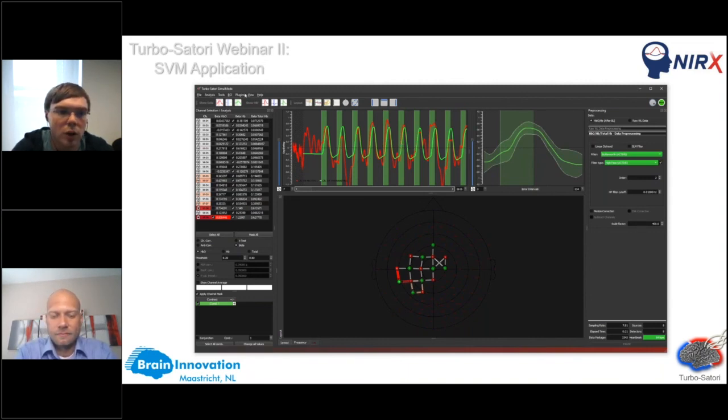We have also created some plugins, which are not available yet, which calculate the quartiles and the maximum % signal change during the localizers, but this can also be done in MATLAB by just grabbing the data over here and running the calculations there. So you're very flexible on how to decide on that, but I would recommend doing this individually, as we know from fMRI research that for neurofeedback you really gain if you do an individual definition of the maximum % signal change.